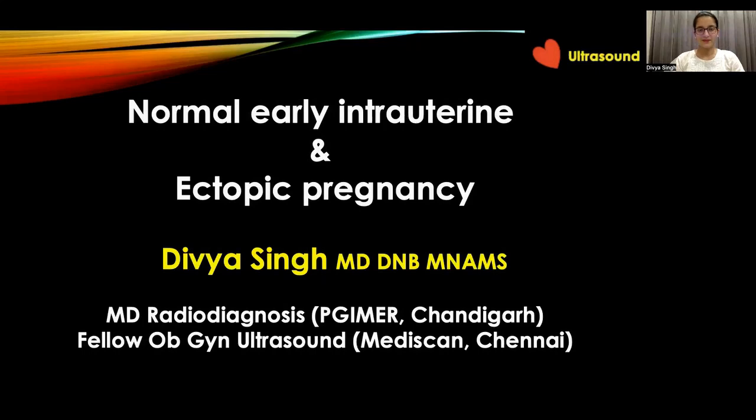Hello everyone. Now that we've learned how to assess the normal pelvis using transvaginal ultrasound, I'll be digressing a bit from gynecological pathology and speaking about the ultrasound appearance of normal early intrauterine and ectopic pregnancy.